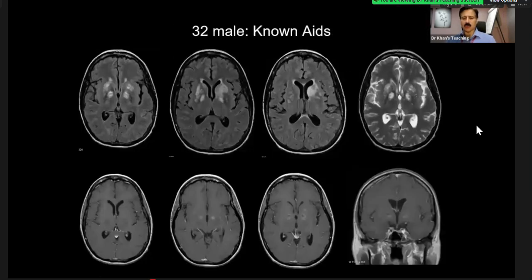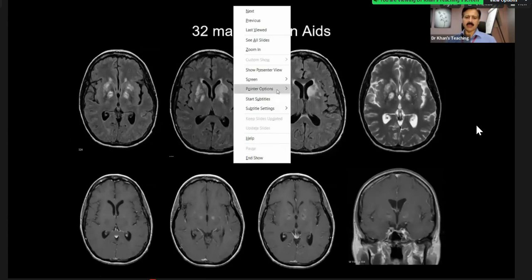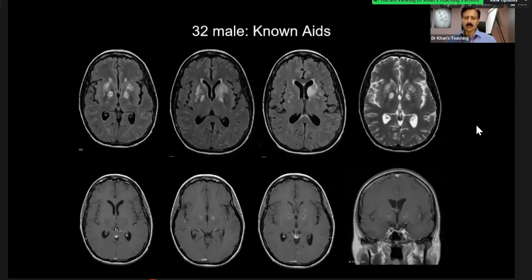What happens is that cryptococcus produces mucoid material, and it goes through the lenticulostriate arteries into the perivascular spaces. This is what we learned, perivascular spaces into the basal ganglia region. It will give you a cystic type of appearance on T2 weighted sequences, for example, bilateral symmetrical. So it has gone into the lenticulostriate perivascular region, and because it has produced mucoid material, which is high signal.